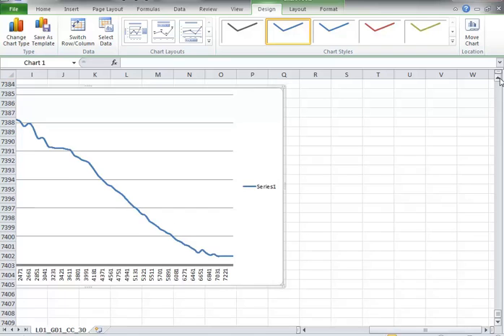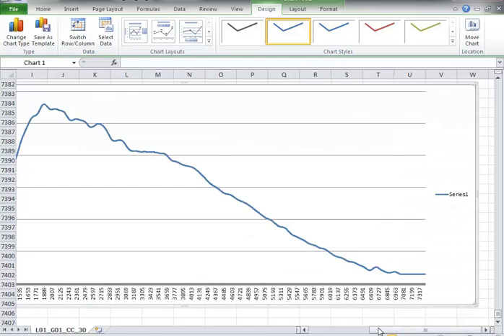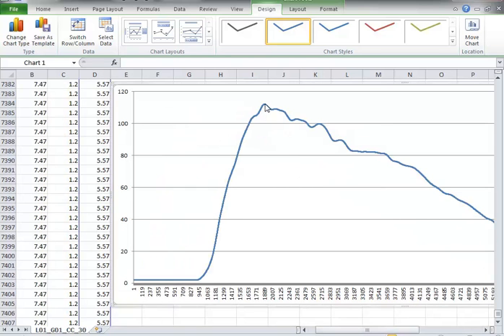If we enlarge the graph that we've made, it will give us a better view of what's going on. So let's do that now, enlarge the graph. Now we can start to look at some of the values. So if we hover over the peak value, we can see it has a value of 112, and that will be 112 Newton meters, as it's a force turning about the joint.